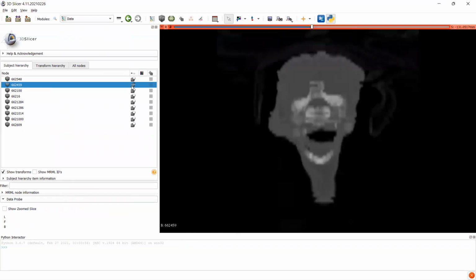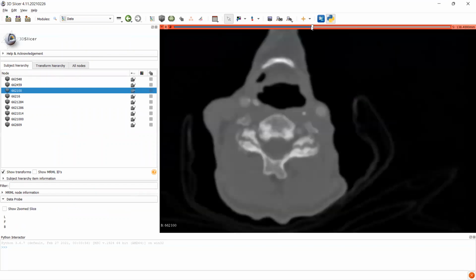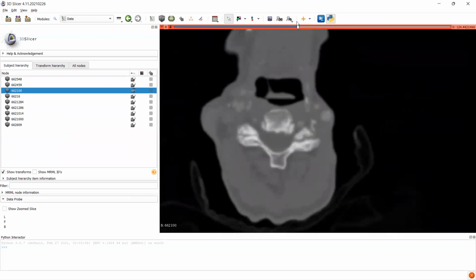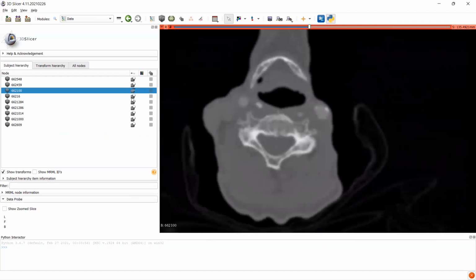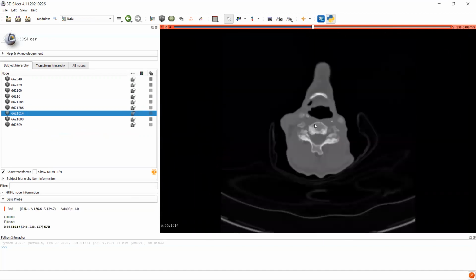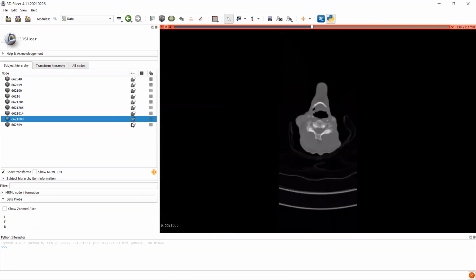This is too low quality. This could be suitable. That's decent quality. It's not great, but that might be the best we have here. I hope. Oh, this is a lot better.